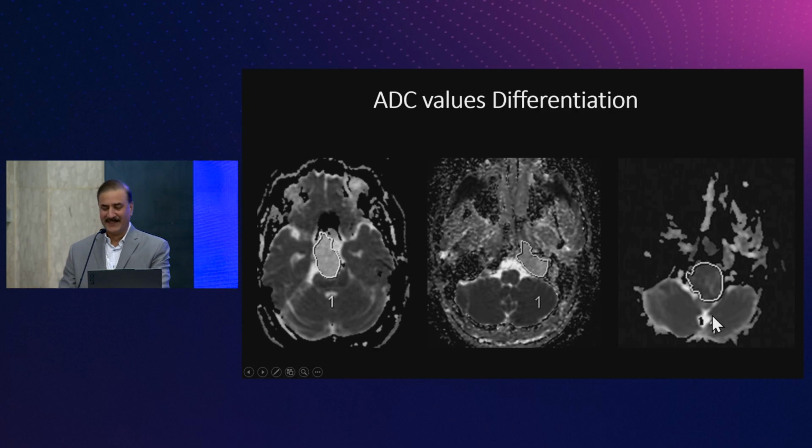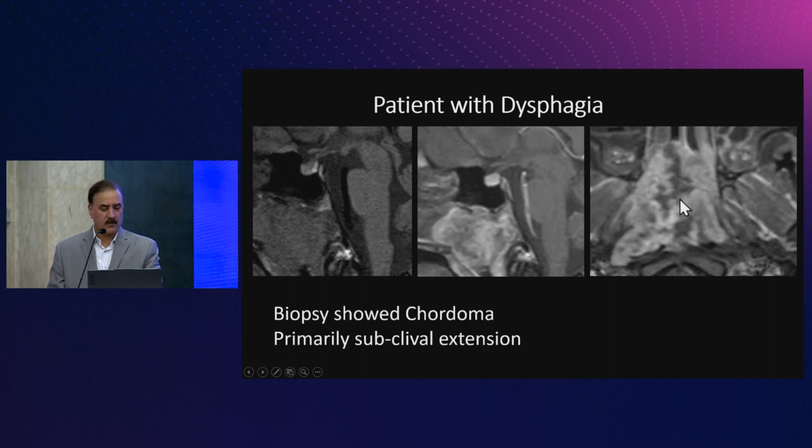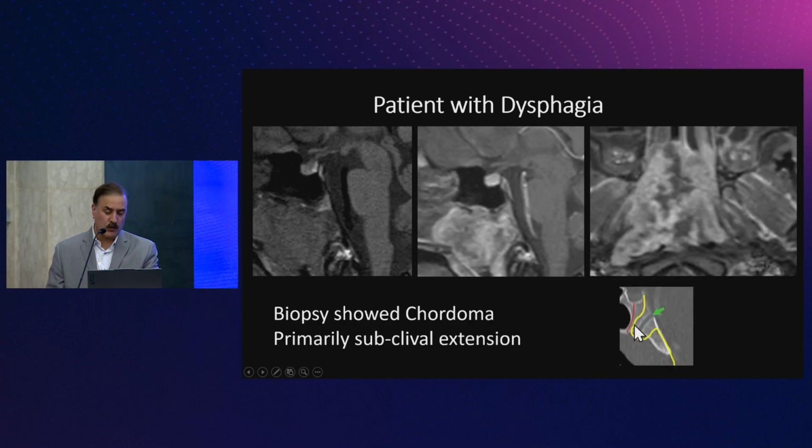Still 30? Oh, wow. Okay, so dedifferentiated chordomas can be completely dark. So I'm going to go a little fast here. So this is biopsy-proven chordoma. Again here, and this is the reason for the notochordal sigmoid turn, you can see that this chordoma was more in the nasopharynx rather than in the clivus. That's because the notochord takes that turn up in the skull base.